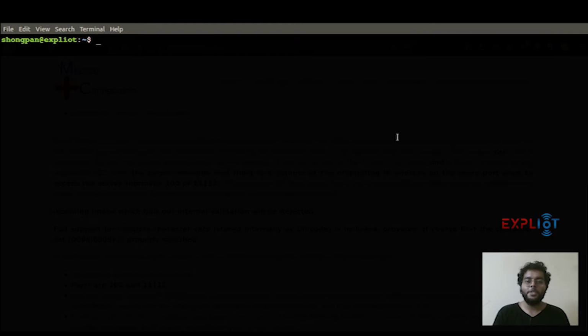So I'm already assuming that you know about DICOM. If not, I suggest you first check out what DICOM is and then return to the video. As for the EXPLIoT framework, it has three plugins for DICOM: the C-find, the C-echo, and the C-store. In this video, I'll be covering two plugins, the C-find and C-echo. The third plugin, C-store, has some implementation issues. So if you have worked on DICOM before and would love to contribute to the EXPLIoT framework, I suggest you get in touch with us via our EXPLIoT framework official project repository on GitLab.